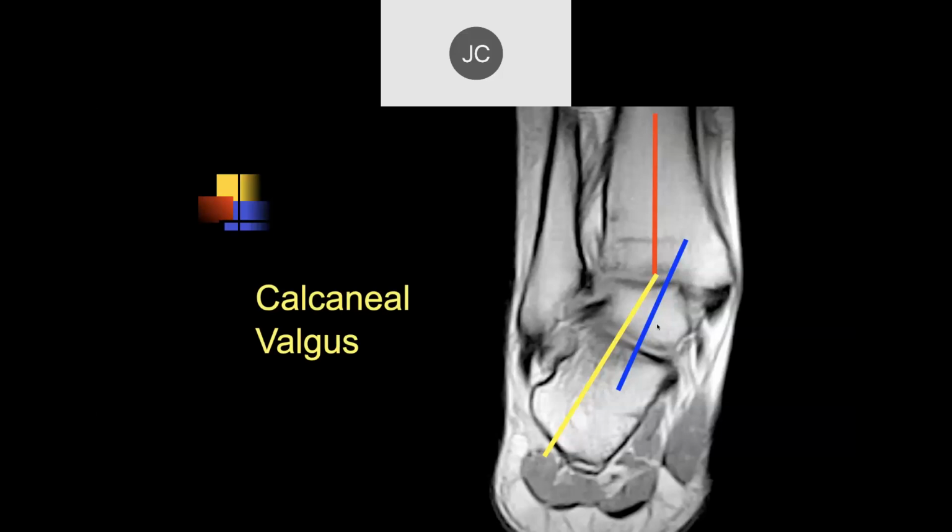And this is commonly associated with a syndrome that I don't know if we're going to talk about now or later, called adult-acquired flatfoot deformity, which is associated with insufficiency of the posterior tibialis tendon, where you lose proper medial tugging onto the calcaneus. The calcaneus goes into valgus like we see here, and it can be stopped by impacting against the fibula here, which is called lateral bony impingement.